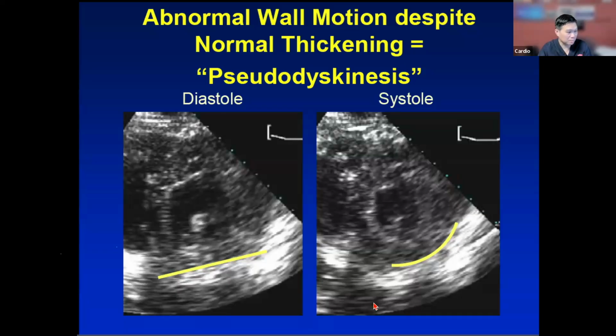Then you can see the bubbles appearing in the hiatus hernia. I've done that when I was young. It's really quite fun. Yes, thank you to our audience for saying soda water. Way back when, I would run down and get a soda pop and image, because you can actually see it.